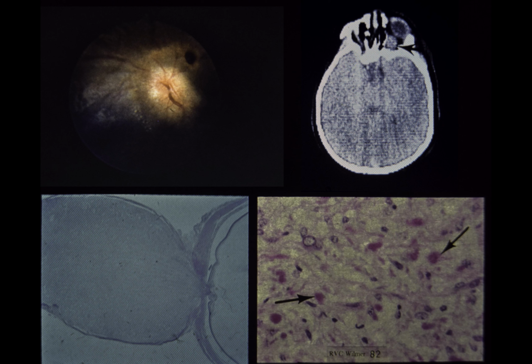Lower left. A longitudinal section shows optic disc edema and massive enlargement of the optic nerve as it emerges from the globe. Lower right, a high-power section through the optic nerve shows numerous plump astrocytes and elongated PAS-positive rod-shaped bodies. These intracellular Rosenthal fibers are found exclusively in the cell bodies and processes of astrocytes, particularly in optic nerve gliomas. We emphasize that optic nerve gliomas are hamartomas rather than true malignancies.